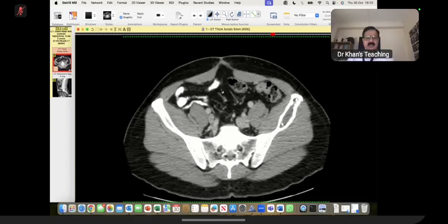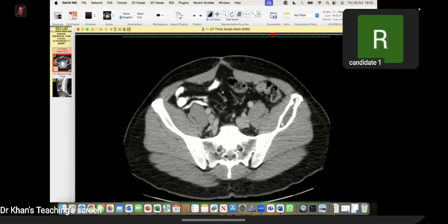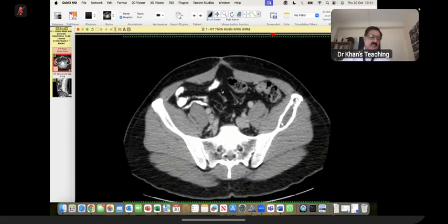If a patient has fibrous dysplasia, it will stay as fibrous dysplasia for the rest of the life. All right. So we can include it in our differential in the elder population also. So the point is that this was a slam dunk fibrous dysplasia. This was the type of case where there was an emphatic diagnosis.